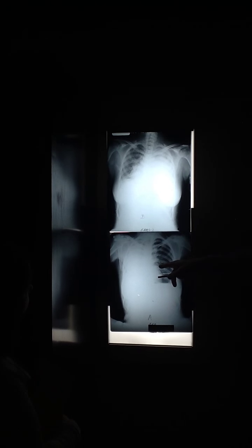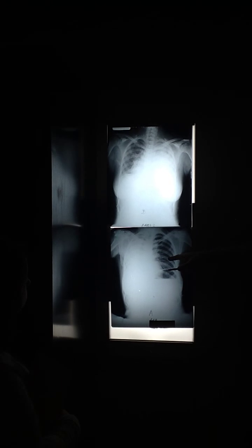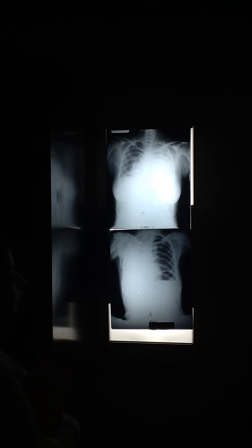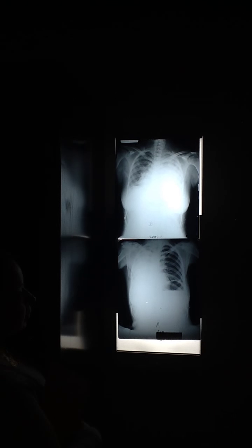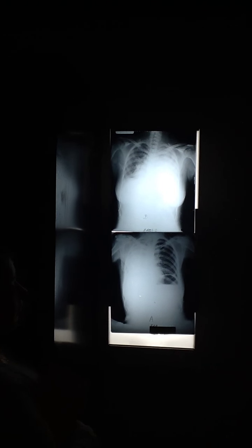This has got to be atelectasis, doesn't it? And it's got to be atelectasis, likely of what cause? Is it resorption, passive, adhesive, or cicatrix? Absorption. Okay, well, we know what happens if the obstruction is in a lobar bronchus.